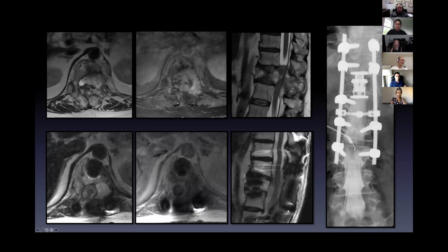So this one, this is a mess, and this is what I have to look at. I hope you guys don't like looking at it either, because I didn't like looking at it. But this huge renal cell carcinoma causing grade 3 cord compression, tumor coming out, compressing the cord. They got a separation surgery first, and then to clean out that epidural disease, did not address anything in the bone. They sent them to me to do a radiation planning myelogram.